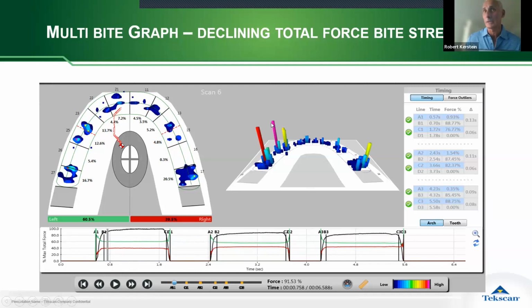Notice there's only one pink at full force. Full force is where B, just past B, full force might be here, but this is where you need one or two pinks as the black line turns sideways. So that's a very good example of someone getting weaker, okay?